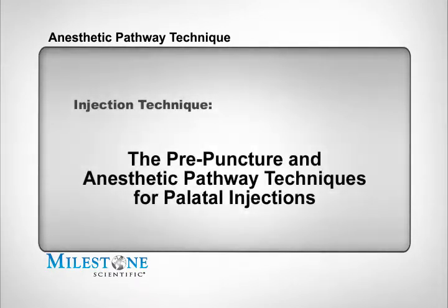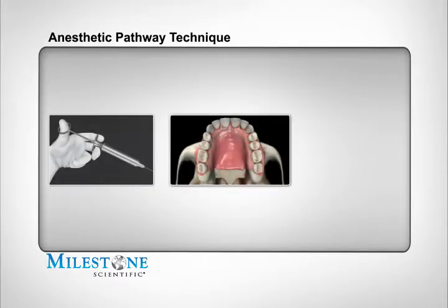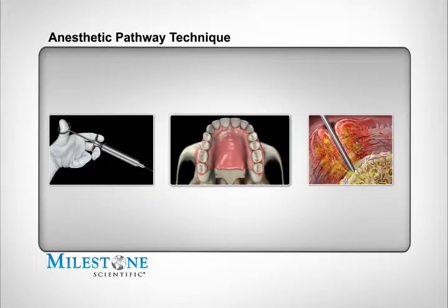The pre-puncture and anesthetic pathway techniques for palatal injections. It's commonly understood that palatal injections performed with a traditional syringe are amongst the most painful injection experiences of the mouth and body. Both patients and dentists attest to the fact that it's almost impossible to give or receive a comfortable palatal injection using a traditional syringe.